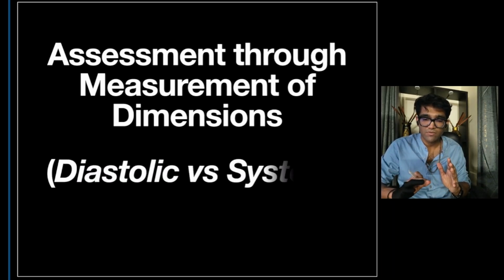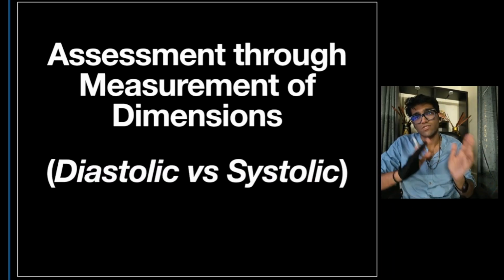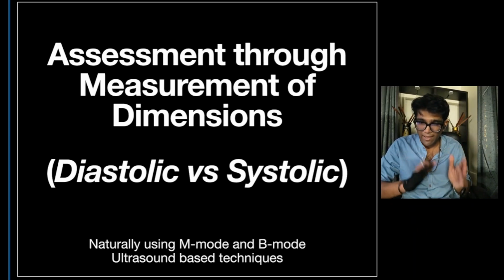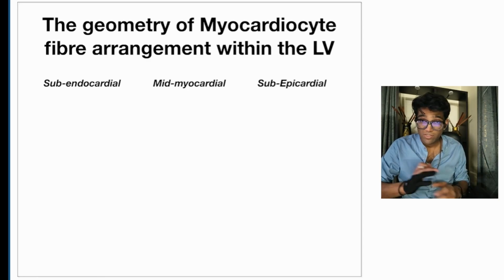Obviously the dimensions will be diastolic dimensions versus systolic dimensions. And naturally we'll be using the M mode and the B mode ultrasound based techniques, because they are the ones that measure dimensions or size.